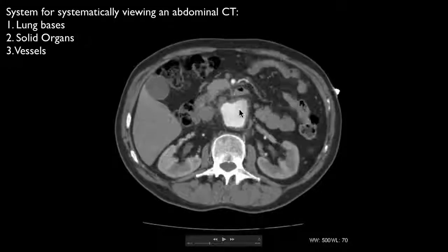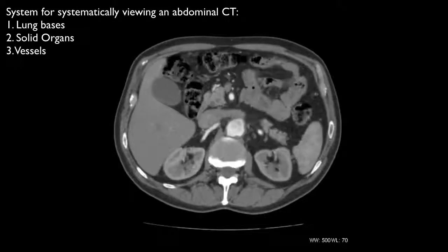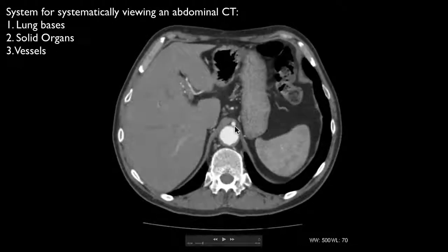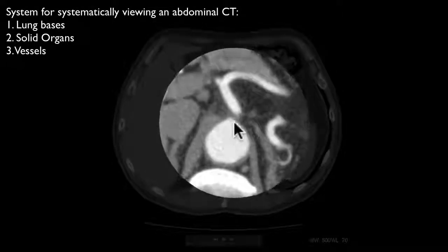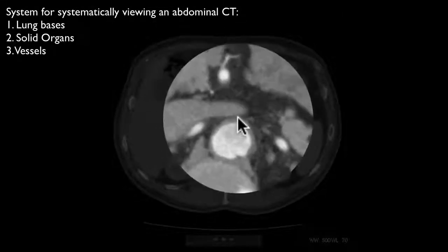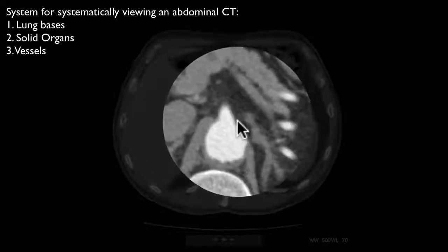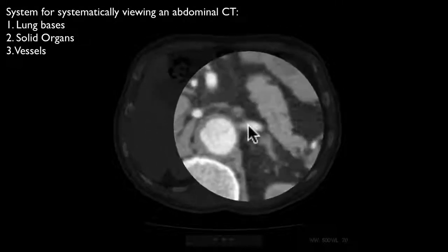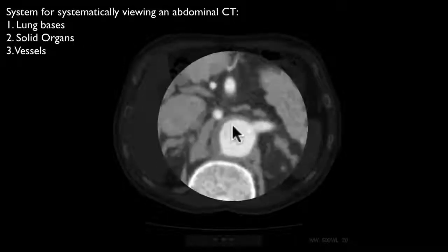So anyway, we're looking at the aorta here because this is a scan done in arterial phase. You can see the major branches coming off here. So that's the celiac axis there. That's the SMA coming off down here. So that's T12, L1: T12 for the celiac axis, L1 for the SMA, then L1-2 where the renal arteries tend to come off. And there's one on the other side.